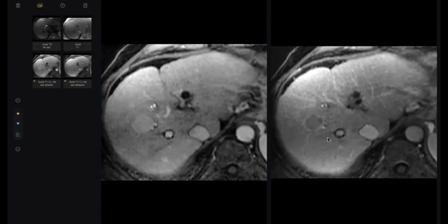Okay, by the way, triphasic MRI and triphasic CT are highly diagnostic of HCC. But however, if your clinician insists on doing a biopsy, which technique will you use? Anterior procedure or lateral procedure?